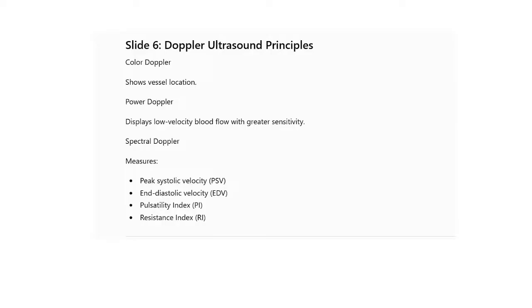So you can see that all the Dopplers are coming in the assessment for fertility. They are now having an application. It's beyond just seeing a fetus, just seeing a fibroid. It's now having a greater clinical application. So when you are holding a probe, it can go beyond the ordinary, beyond what you know on a daily basis.